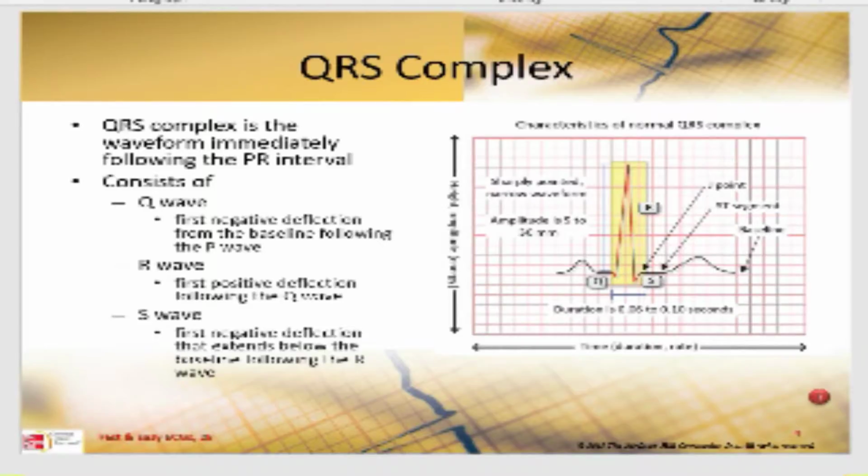So the QRS complex is usually upright. It's larger than your P waves because the ventricles depolarize using a lot more muscle mass. So it's a larger section of muscle that is being used to depolarize. And the ventricles depolarize so fast that it usually makes that QRS look very thin, thinner than other parts of your EKG. So it looks like it's going to be skinnier.